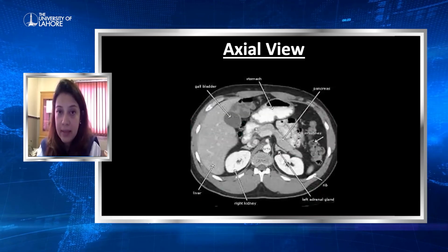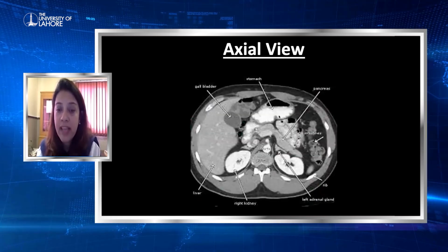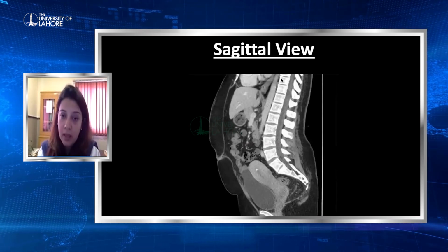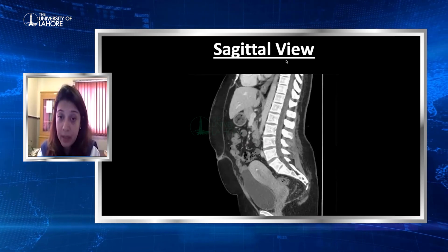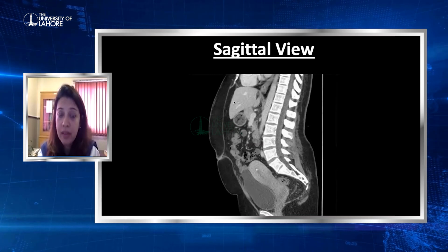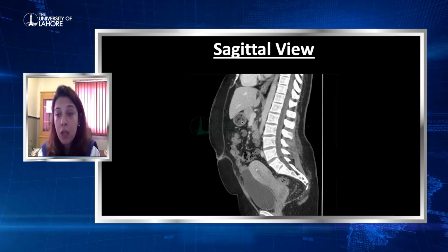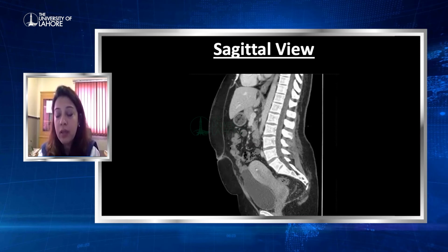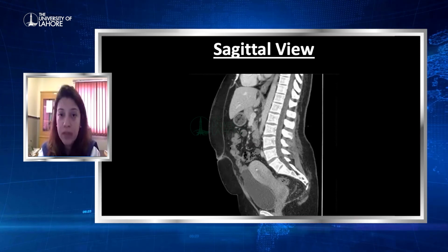So first, this is known as the axial view, right? And this is the sagittal view. So you see from the side as well. Sorry, this is the backbone, and this is the lumbar vertebrae. This is the uterus, the urinary bladder, some part of the liver, part of the stomach. So you can see a pathology in 3 dimensions, and you can give excellent results based on that.